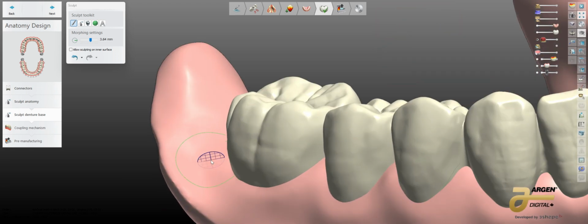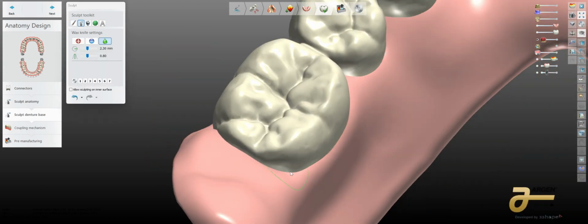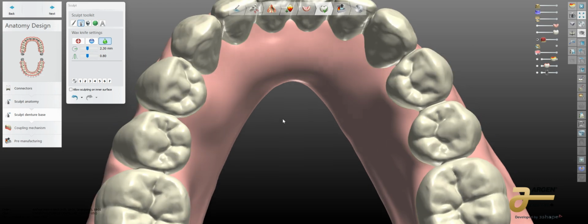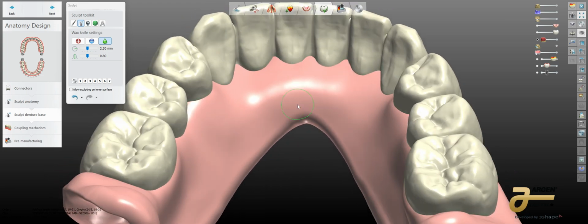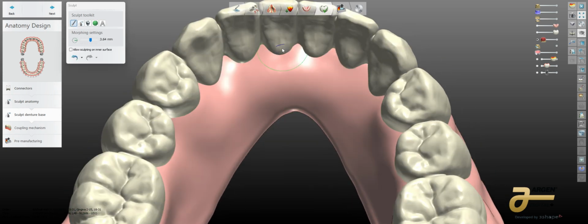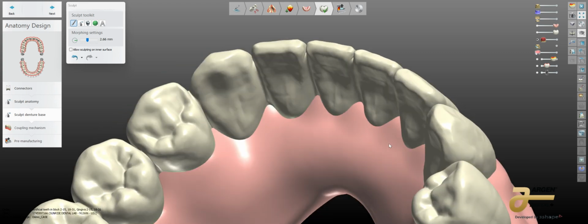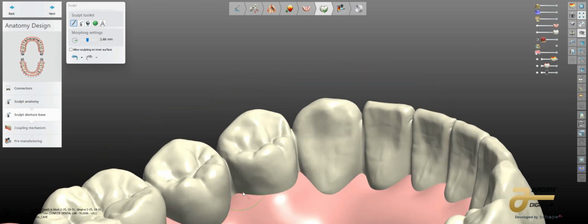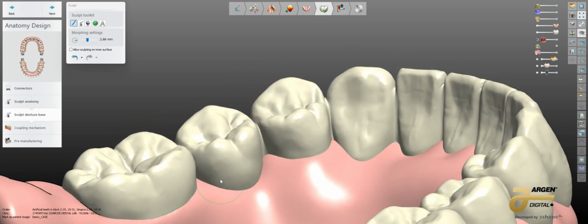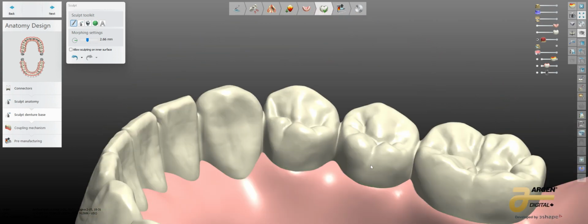And while I've been a denture technician for 40 years now, doing dentistry, a lot of people hate digital dentistry, but more people hate dentures overall, whether it's in analog form or not, because they just don't understand it. It's the most simplistic approach. If you understand how to look at negative space and understand the landmarks and information that is given to us to come up with a very good path to be able to start with your centrals and follow things back, you can get rather close.